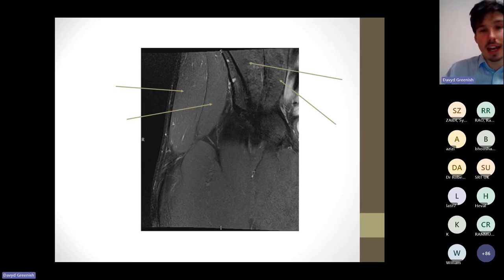Yeah, perfect. So we've got iliacus medially here, and then iliacus forms together with another muscle here and travels inferiorly. That other muscle is the psoas muscle. So they're going to become the iliopsoas tendon to come further down. And yeah, lovely. That's really good. Well done, guys.